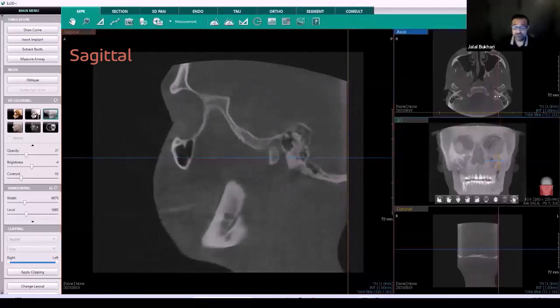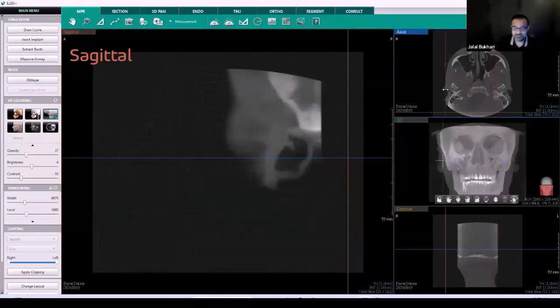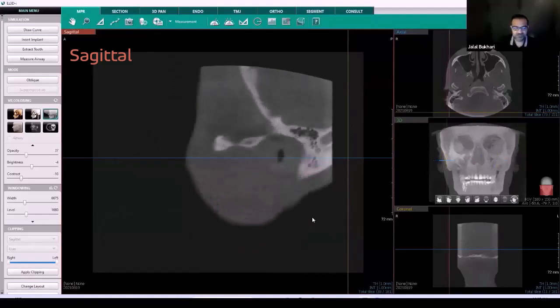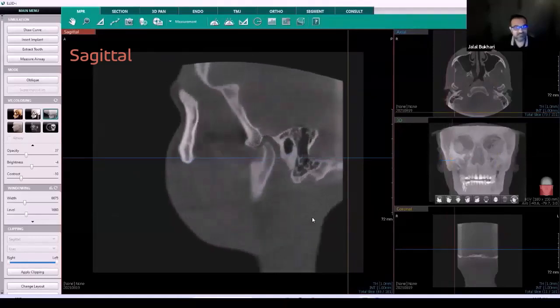So now, finally, when I go through the sagittal section the last time, I will be going through the osseous structures. My favorite view in evaluating the TMJs is actually the sagittal section. There are other ways that you can view the TMJs; certain software such as this one has the capability of focusing on the TMJs, so you can go slice by slice.